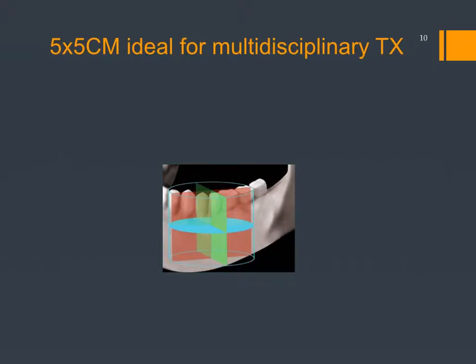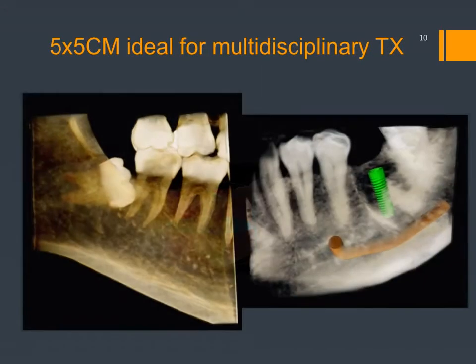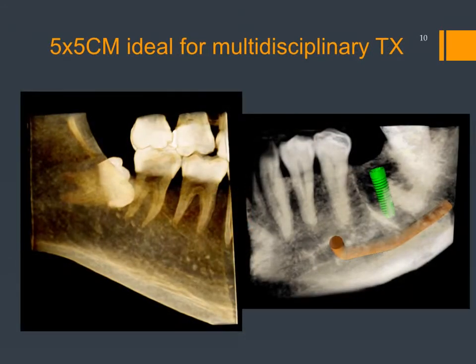The 5 by 5 is good for interdisciplinary, and you can tailor these views for the project that is planned, and they're easily constructed just to the best advantage.